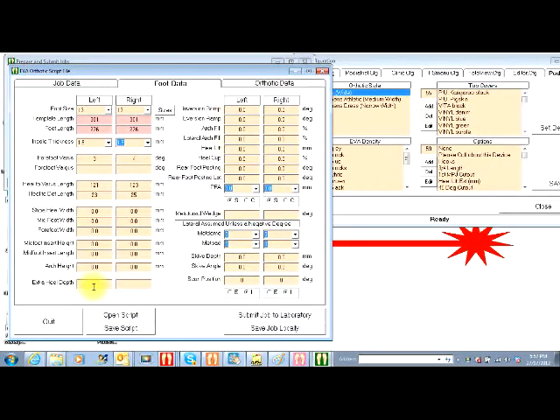If they're going into football boots or they want more lateral expansion than naturally comes out, they can say they wanted another 2 mils deeper, or etc. Inversion and eversion ramp keeps that tilts the whole foot right over. Obviously, inversions on the medial side, eversions on the lateral side. It tilts the whole device from side to side.